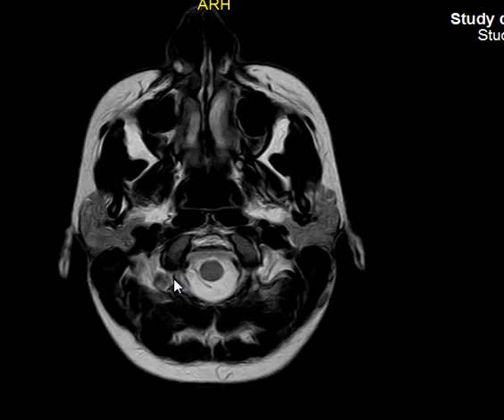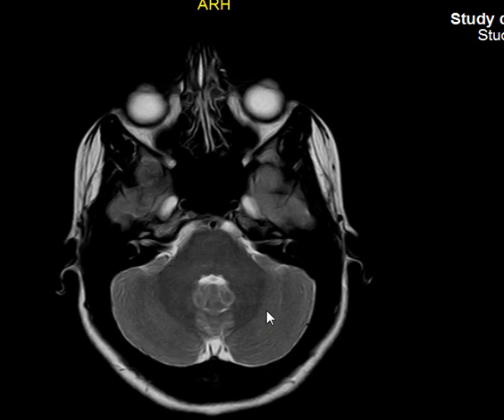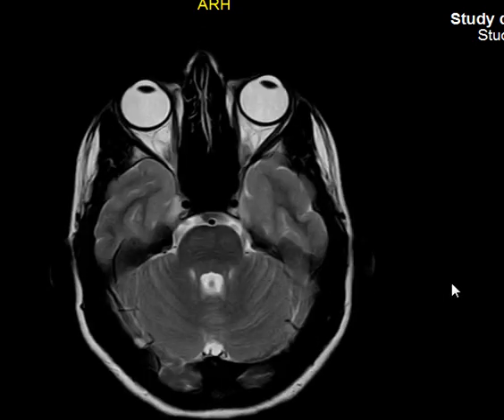That's how it's produced. Also, we have choroid plexus elsewhere, like in the temporal horn, a small choroid plexus. We have in the fourth ventricle another choroid plexus. So it's not one; there are multiple. The biggest one is in the lateral ventricle. Okay.